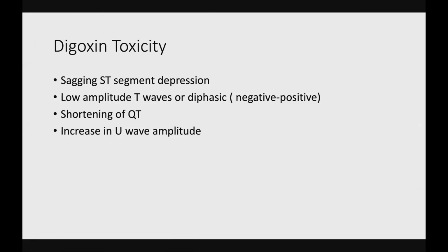The QT gets shorter, and in fact, on her admission ECG, she came in with nausea, vomiting, and all the dig toxic symptoms, and she had pretty solid U waves as well at the end of the T wave, and I'll show you some examples of that another time. But the tracing this patient had this time was really poor quality, so I didn't bring that one for you.